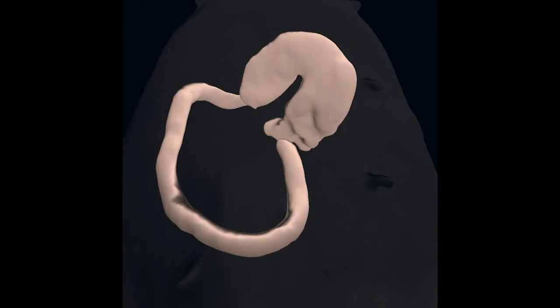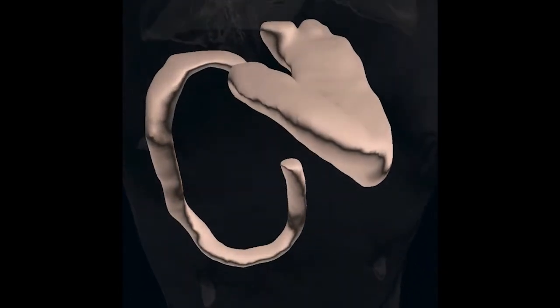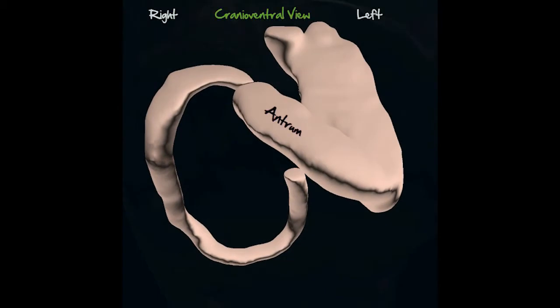The stomach is also divided in several segments. The pyloric antrum connects to the duodenum via the pyloric canal, the gastric body extends ventrally, the fundus is to the left, and the cardia is located adjacent to the termination of the esophagus. Being able to comprehend these anatomical relationships makes ultrasound assessment of the GI tract a much easier task.